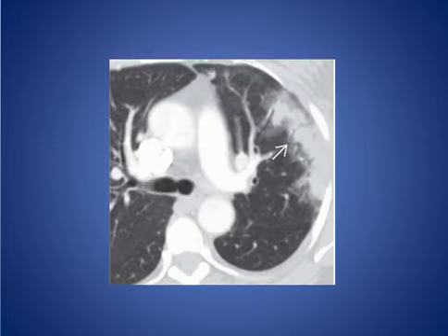Here we see axial contrast enhanced CT scan patient. There is airspace shadowing in the peripheral left upper lobe, and it is due to radiation fibrosis, and it is seen in the following next few months.